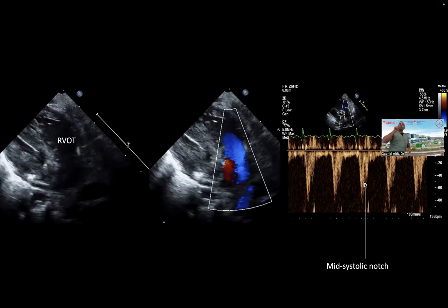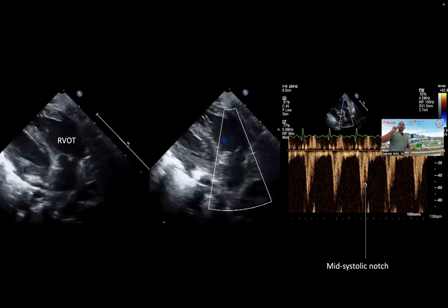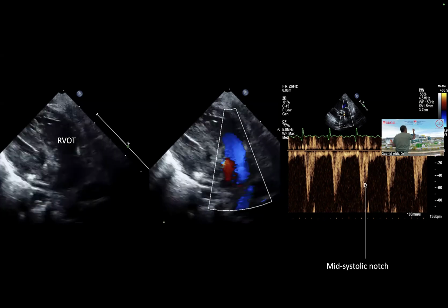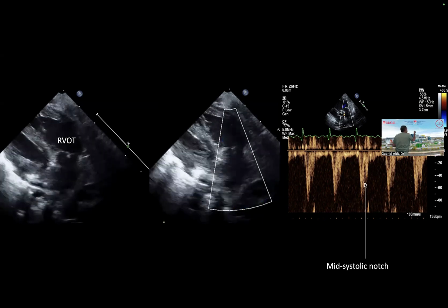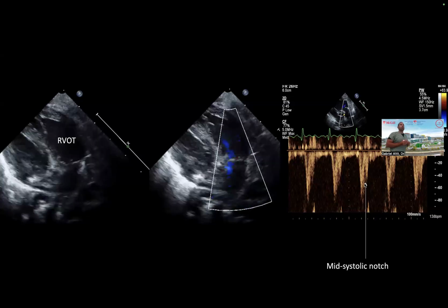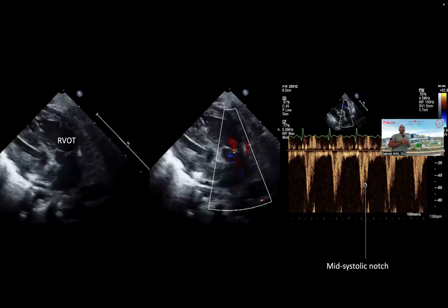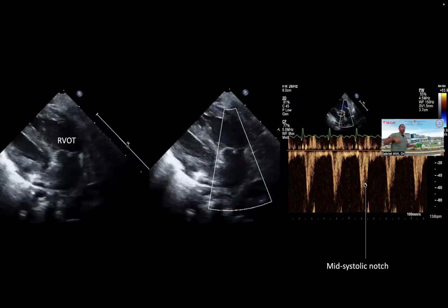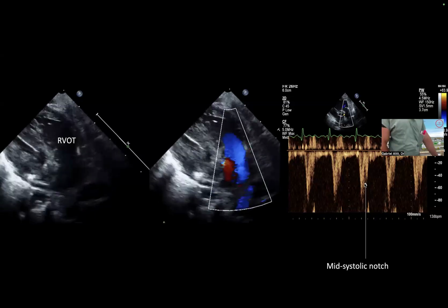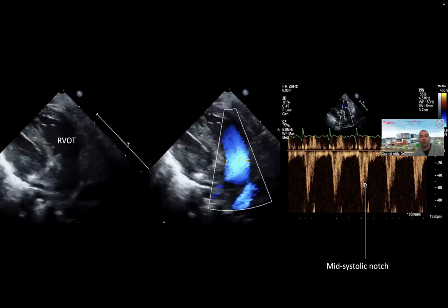But you're right that sometimes when you have very severe pulmonary hypertension, we get something called swirling. So what is swirling? In some patients with such severe pulmonary hypertension, you'll actually see during systole flow going like this. And then when the valve closes, sometimes you even see flow going backward. We call this swirling. It's like a toilet bowl. You see kind of this effect. That's in very severe advanced pulmonary hypertension. Rare that you'll see that in the newborn.